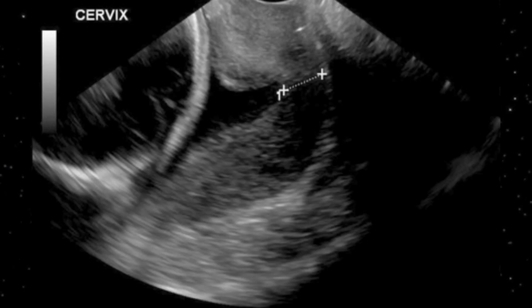The third thing, which is pretty clear here, is bulging of the membrane into the endocervical canal. The cursor shown down here shows that only up to 1 centimeter of area has been left for the membrane to be expelled through the external os. So this is a quite dangerous condition, it needs immediate attention.